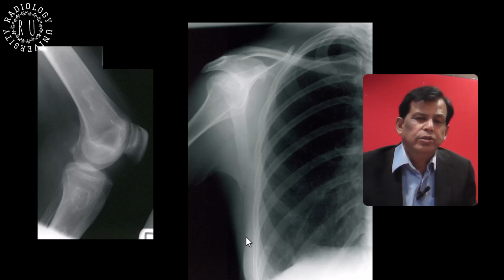Do you get any changes in the lung in these patients? If I have to corroborate these findings in a scleroderma patient, then this is interstitial fibrosis with traction bronchiectasis, bronchiectatic changes. So lower zone fibrosis is more common in scleroderma.